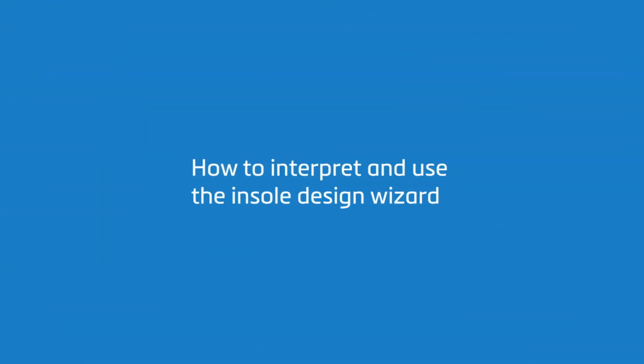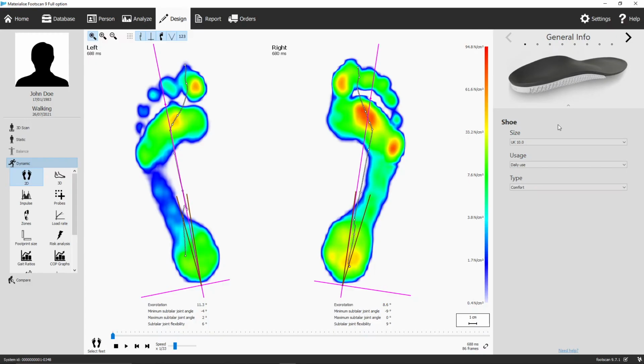How to interpret and use the Insole Design Wizard. Before you can start designing your Phits orthotics, we want to explain to you the basic principles of the Phits design software. The Phits design software uses the foot scan pressure plates or 3D scanners to calculate specific insole corrections.